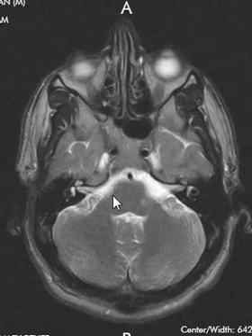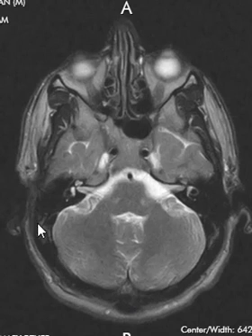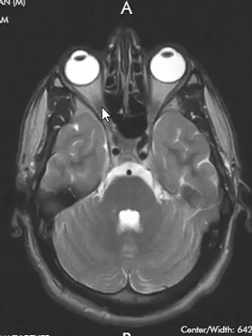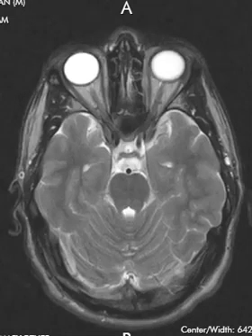The other thing that can be dark is compact bone. So sometimes you'll see some dark band around the back like this. If you have dense skull bone here, this will be dark, and if you have air in here, it'll be dark. There's also bone in here too, but the air and the bone are both just black, so the whole area just looks dark. Same within the sinuses. They are very dark because there's lots of air in the sinuses.